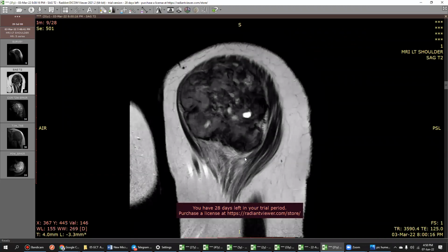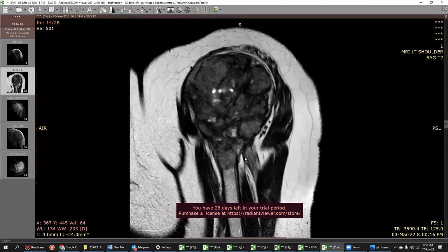Okay. So underlying bone is involved, and I think these are some fluid levels, but which are disorganized. And it is a very heterogeneous appearance, and these are not typical of aneurysmal bone cysts. So I would say my other possibility, like telangiectatic osteosarcoma, is my consideration in this with these appearances. I would like to have a look on post contrast if these are enhancing.